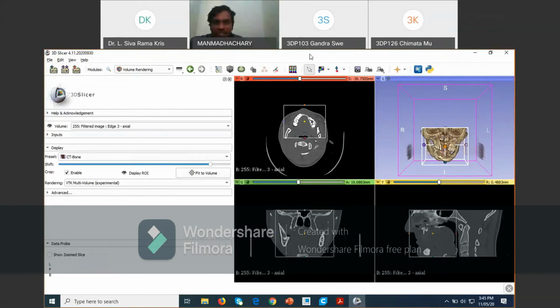Okay, let us see. Vivek Prabhu says four split screens arrived, sir. That's no issue. Some people are unable to load. I don't know what the problem is. Crop lines not appearing, sir. What should I do? For this one, here the enable symbol is there. You have to click on the enable symbol, then you can get the crop lines.